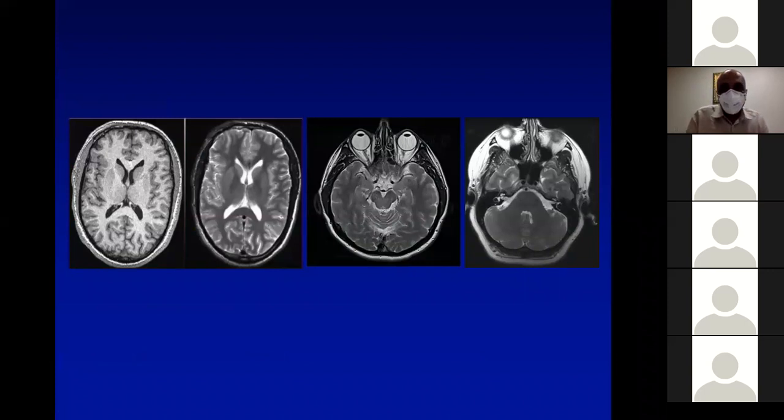These are MRI images, and now you can identify that on MRI images, there is poor visualization of the skull bone. It appears as black, right? Now, the brain parenchyma and the brain anatomy is pretty much the same, obviously. These are orbits with 2 eyes. These are lenses. You can see it better on MRI. Again, this is the brainstem. This is the cerebrum, left cerebrum. This is the right cerebrum, and a little bit of cerebellum on this image, right?